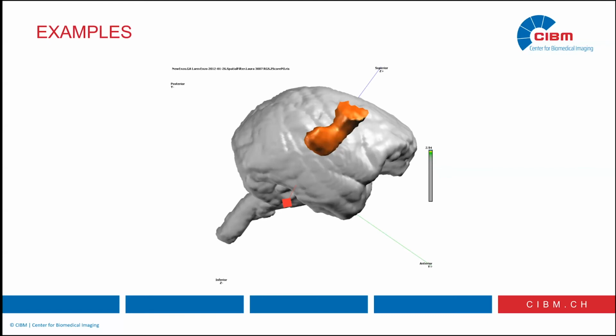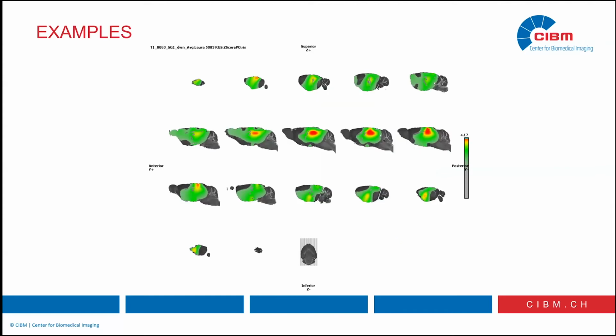That's a side view of the same monkey, which was a left arm stimulation, and that's again the mouse. Unfortunately, I forgot what the experiment was. Maybe it was smelling something, and there was something going back and forth within the deep structure of the mouse.